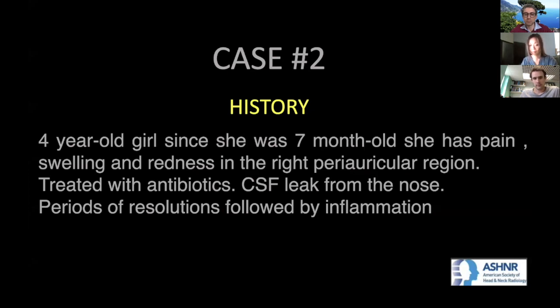So you think that's acceptable? Yeah, absolutely. The difference between IP3 and IP2, which are probably genetically determined, is that IP1 and common cavity are probably due, at least this is the theory, to an abnormal blood supply from the internal auditory meatus during development. So in this case, we label it as IP1, but this is really in the middle. We could see some separation, but the internal auditory canal was going actually between the two. So it's really a spectrum.